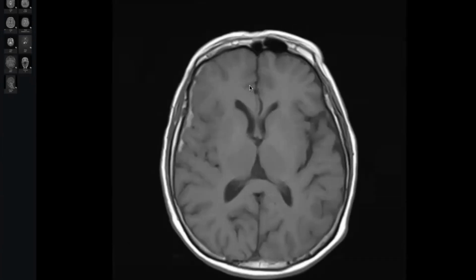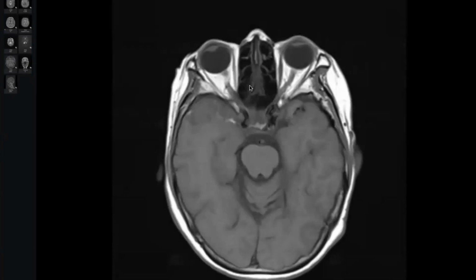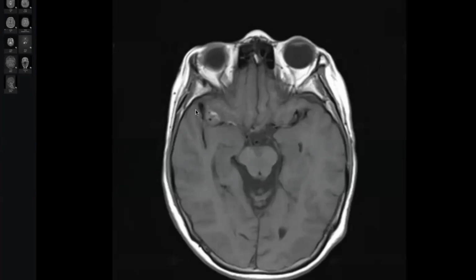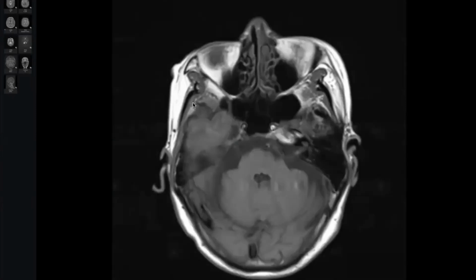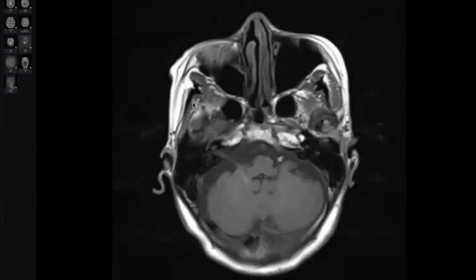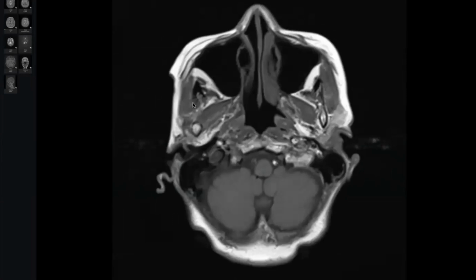So again and again, what we will do in Viva: first we look at the brain and the ventricle and the most common non-review areas. Doctor, I picked up this one in the first round. Okay, no problem. Keep it in mind and return for the review areas. Why? Because maybe there is double pathology. I'm looking at all review areas, the vessels.